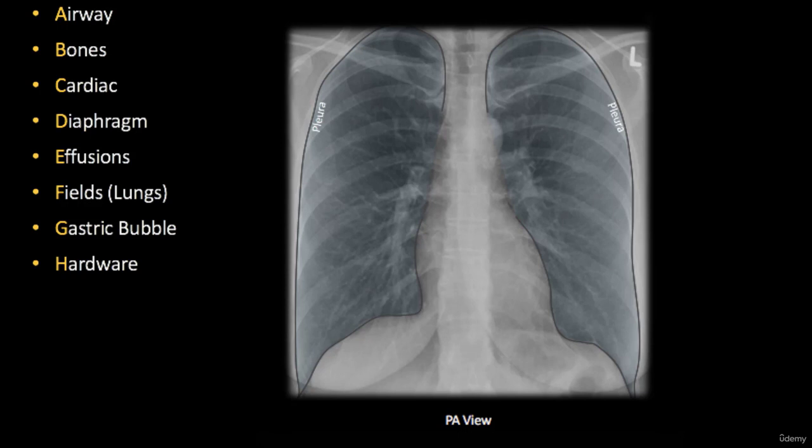And have a look, we have no space between the lung itself and the thoracic wall. They are absolutely adjacent. We have the layers of pleura there, but they are invisible on the X-ray. Any content like air around is an indication of pathology. We also look at how symmetrical the lungs are, sandwiching the mediastinum in between, in the center. Any deviation here will indicate pathology.